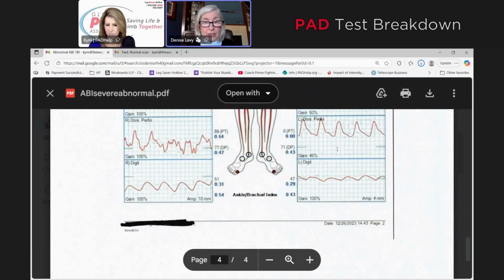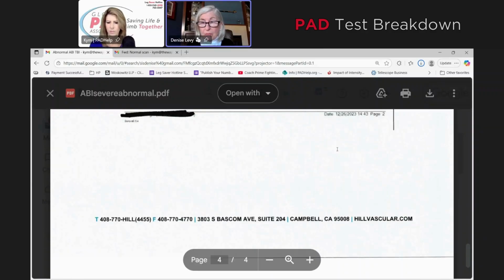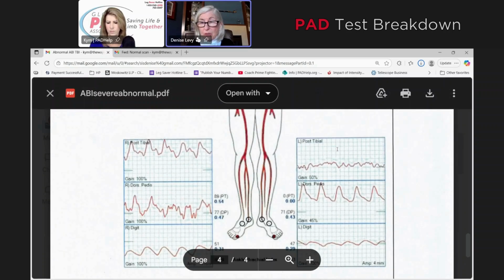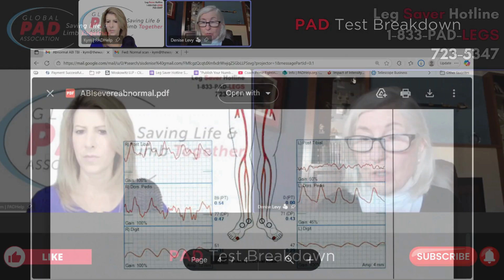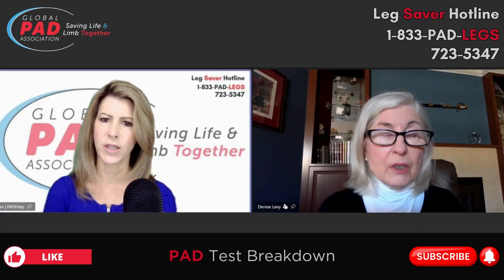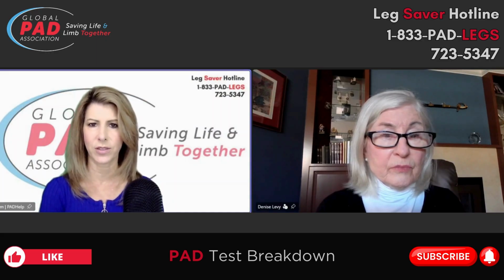I wouldn't exercise this patient because they're already at moderate to severe. So this patient would need a full scan first and then an angio. In a situation like that, we always say that the doctors don't just treat based on the imaging alone.